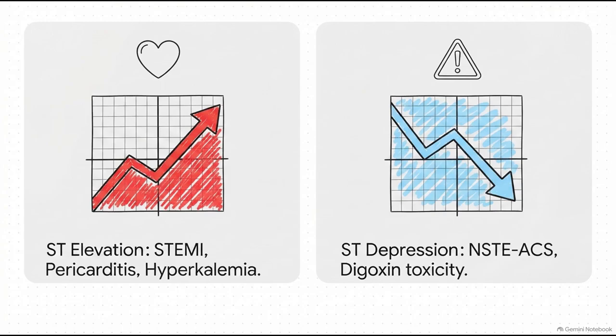This is it, the final and most critical step. We are examining the ST segment and T waves to catch a heart attack in progress. Normally, the ST segment is totally flat. When it shifts, it is screaming for help.